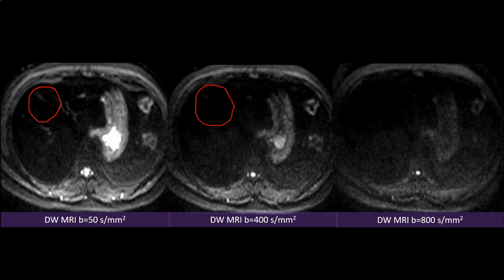And this reassures everyone that we are not dealing with metastasis, because metastasis in a liver which is fatty or showing iron overload will not share the fatty content or the iron content. So they would have been seen normally as the stomach is seen in these diffusion weighted images, and will have their usual diffusion restriction as metastasis.